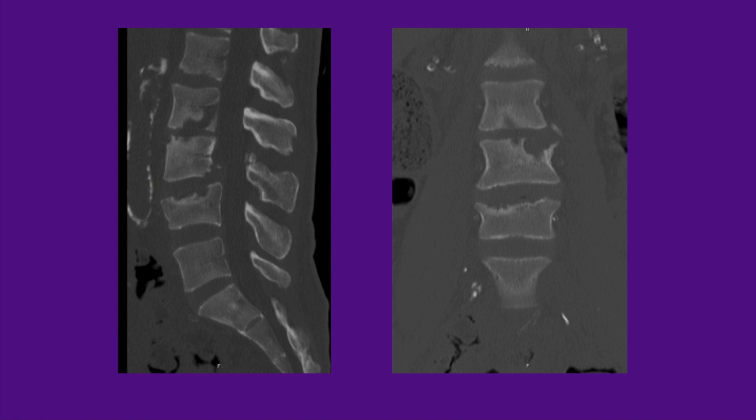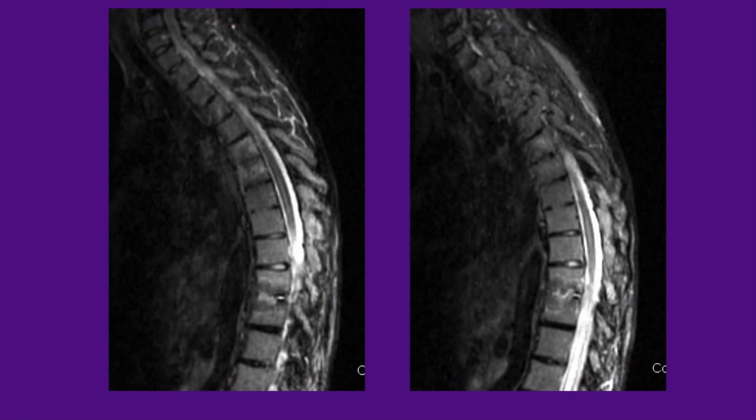Other confounding variables: here is a patient with profound destruction of the disc space, sclerosis, debris, some degree of malalignment, and this was a patient with neuropathic arthropathy. Here, a patient with dense vascular calcification in the aorta and multiple areas of erosion involving the end plates. However, this was not infection. This is known as the discopathy of dialysis in patients with chronic renal failure and can be due in part to deposition of amyloid.